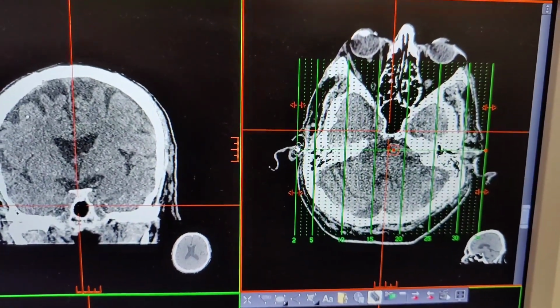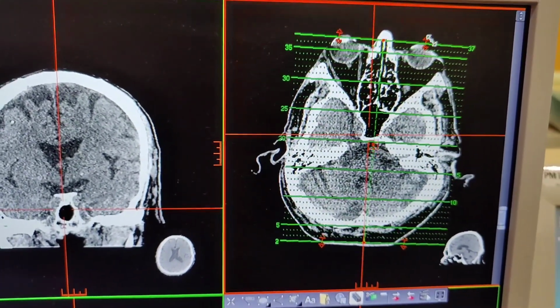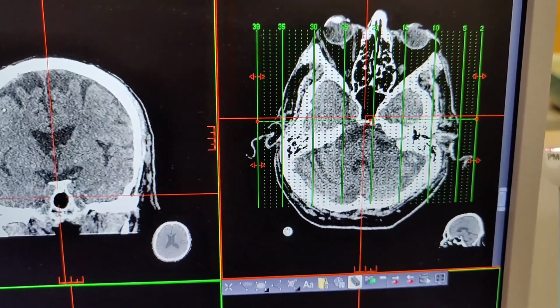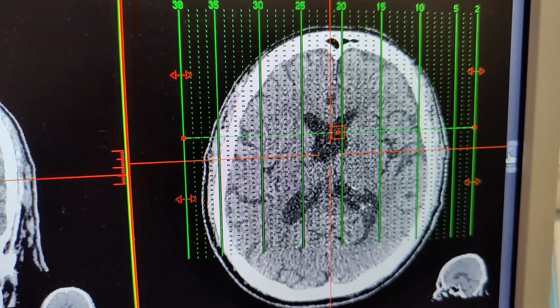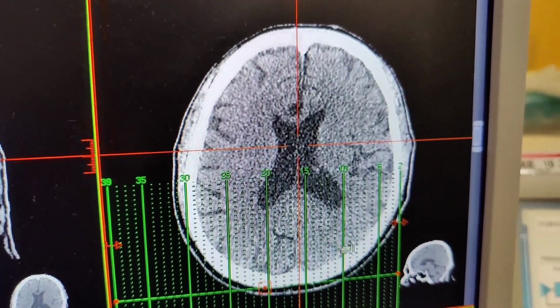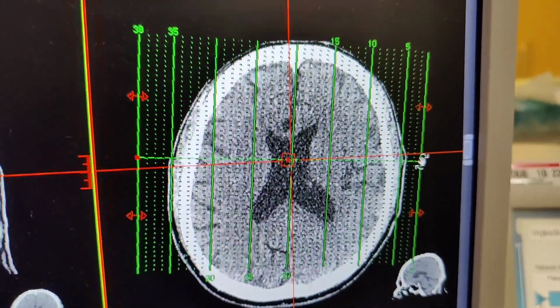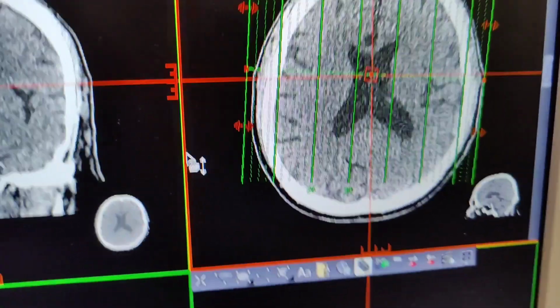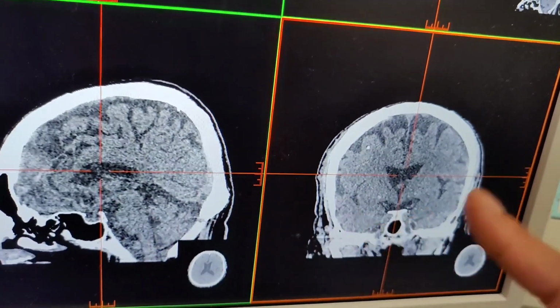And if we want to make a coronal, it depends on the facility, back to front or front to back. Okay, so if we scroll through this, you see this midline right there? I like to follow that line. So I rotate this and make sure that line is the mid-sagittal line. And collimate. And then sagittal. Boom. And you can use any of these to make an axial.